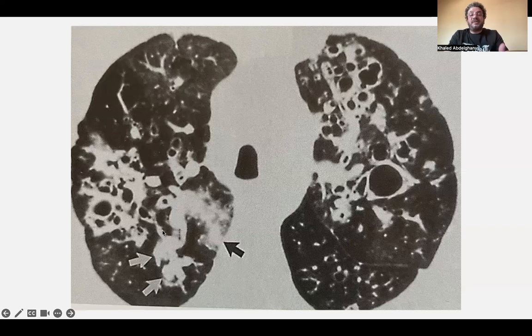Serial images and video of a case will help to detect this continuity with the parent bronchi. Plus, this patient already has dilated bronchi here, mucus filled, giving the bronchocele appearance. Actually, this patient has allergic bronchopulmonary aspergillosis.